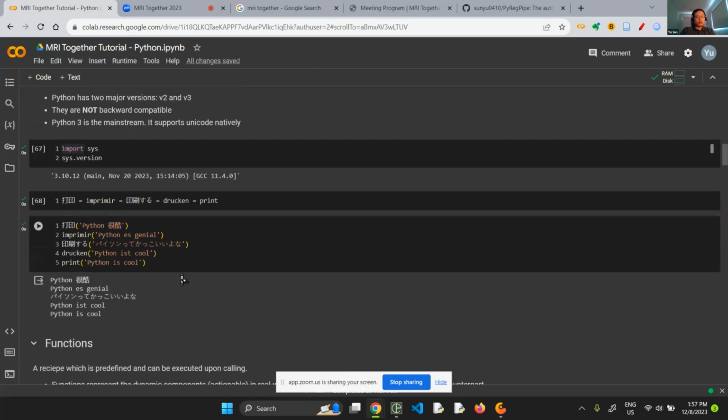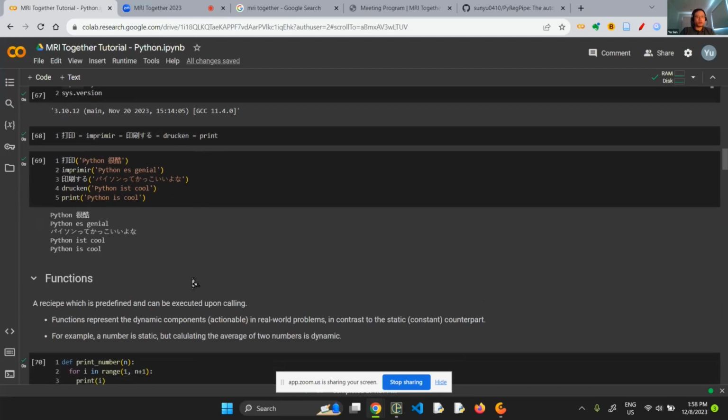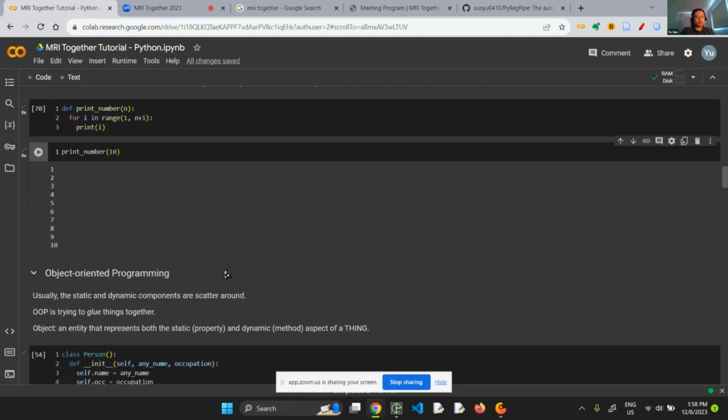Okay, so these are building blocks. They are not very related to image processing, but this will be useful when you come to, say, wrap several steps in image processing as a function and do it in a modular and reproducible way. This is the way to go. So try to define efficient, modular, self-contained functions to do each of the key steps in your pipeline.